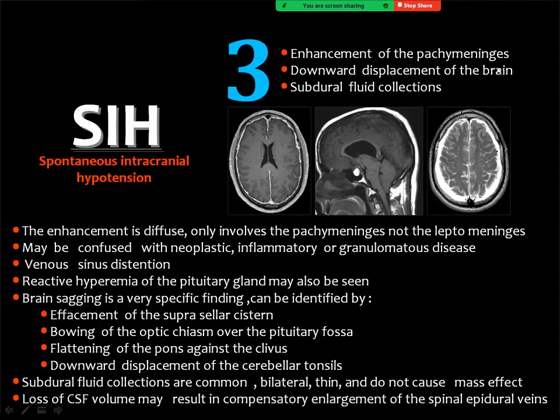Enhancement of the pachymeninges, meaning the dura, not the leptomeninges, downward displacement of the brain through the foramen magnum, and subdural fluid collections as you see here. The enhancement of the pachymeninges may be diagnosed as meningitis sometimes, or may be confused with lymphoma, for example, or granulomatous disease. Distension of the venous sinuses and reactive hyperemia of the pituitary gland.